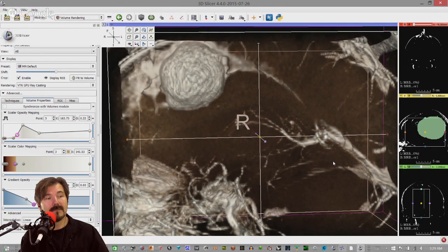I think it'd be a little bit more difficult because, as you're playing around with these, let's say we're on CT, if you're playing around with the densities, that'll get difficult if you drop out the bone density, but the mass itself has a bony component to it, as teratomas can have, or even calcification, which would have a density similar to the bone that you drop out. So yeah, it would be interesting. I think you'd have to do more tweaking if there was more of a heterogeneous component to the tumor itself.